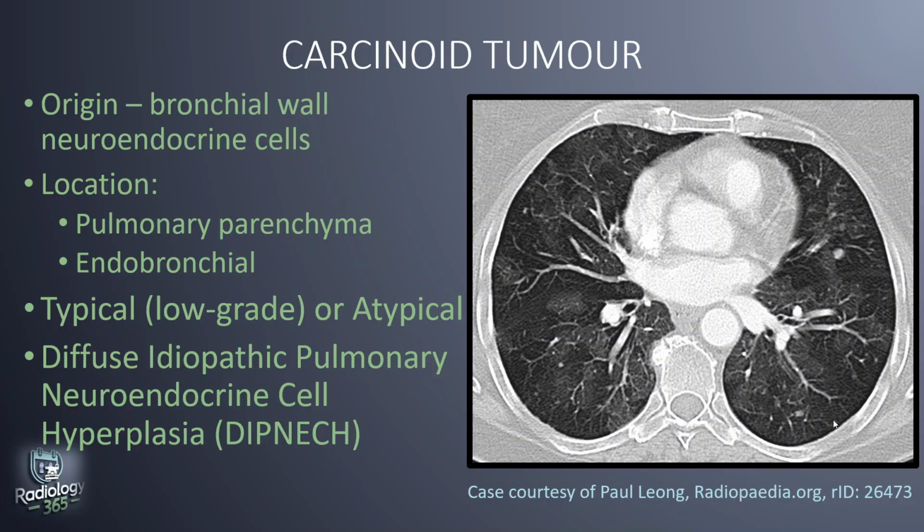So the areas of air trapping would show as abnormally hypodense areas on the contrast enhanced CT, and the relatively dense areas or ground glass areas are rather the normal lung. In this image, we see a rounded right middle lobe pulmonary nodule. You can see how very closely related it is to the segmental bronchus, and there are multiple other tiny pulmonary nodules scattered throughout both lungs, like one here, there's a tiny one here, another one here. And we can also see clearly the mosaic attenuation.